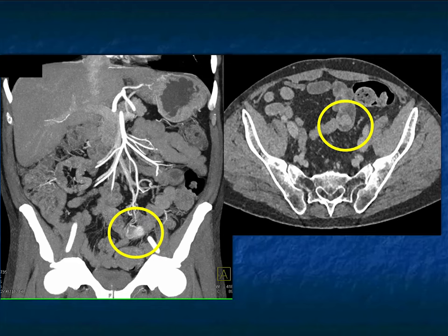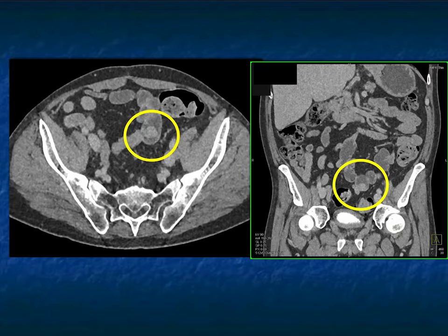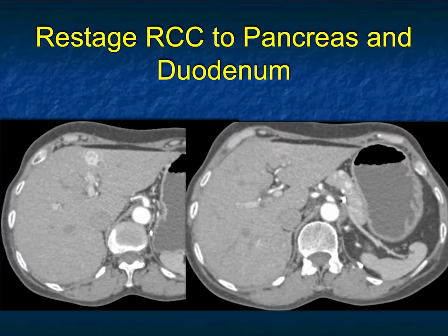But there's the lesion. And again, a good example why the arterial phase is so much more valuable, because the lesions are very obvious. You're not making what I would call a difficult call. Now, yes, you should be suspicious, but it's surely a lot easier on those arterial phase imaging.